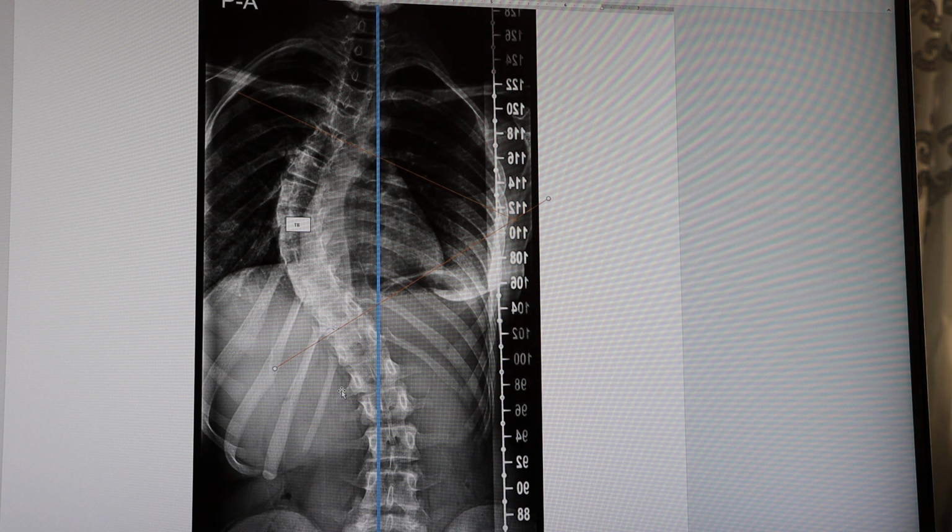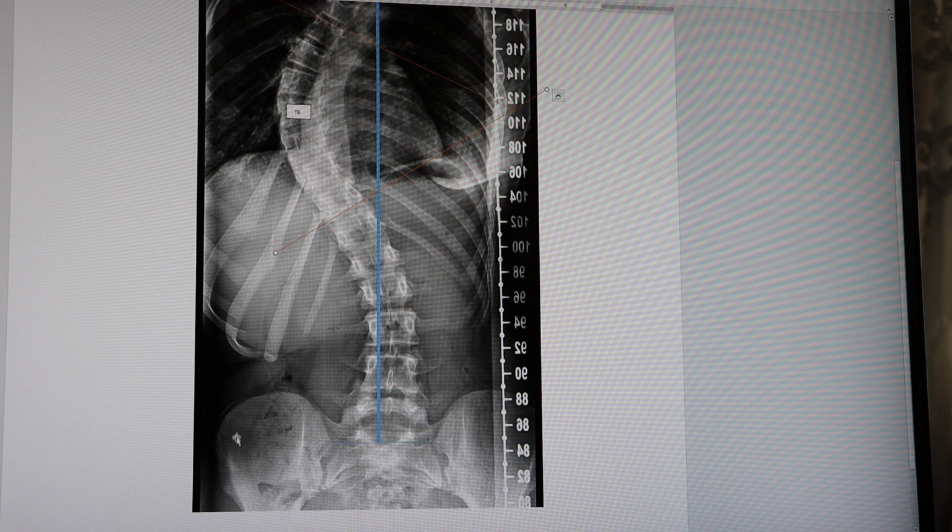And then we will go for identifying the rotation, the stable vertebra, the neutral vertebra, and some other parameters related to the alignment of the spine. Again, Risser sign, we've talked a lot about it, and you've been taught how to measure it. Now we do have the pelvis here, and we can see the apophysis and the ossification. So what you'll have to do is to draw your line to separate it into equal areas, and then identify the ossification limits, and based on that I give it a number representing a maturation.